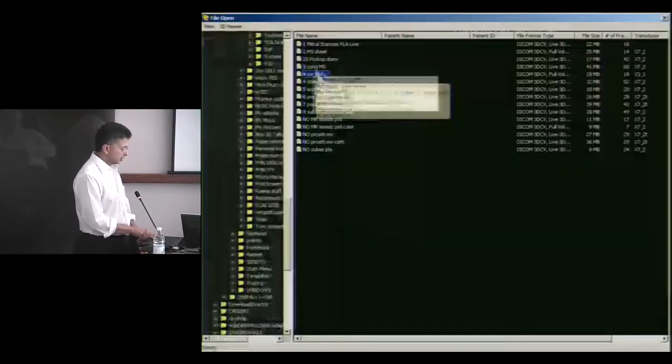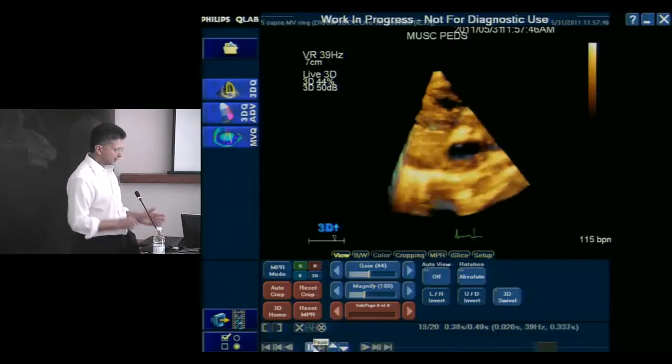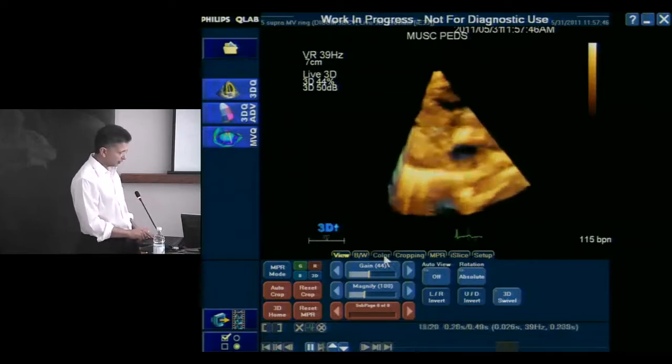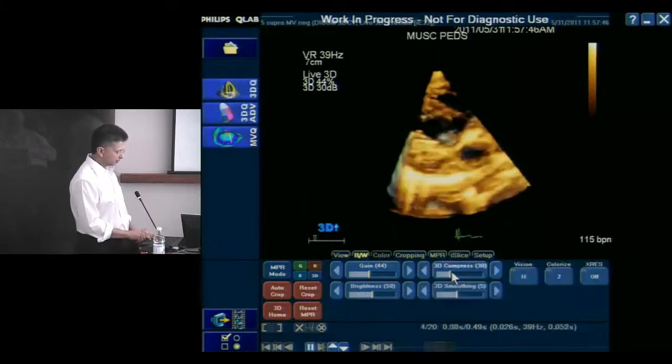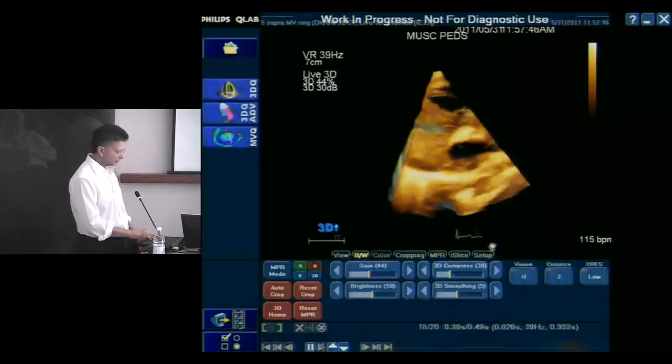All right. The next thing I'm going to show you is a supravalve ring. This was a kind of a complicated ring, and this was an interesting patient. It was a baby with coarctation of the aorta and this ring. Of course, inevitably also with subaortic stenosis and so on. And this was a big question because we had impressive gradients across this. Oh, there was a VSD as well. Impressive gradients across this ring. And the question from the surgeon was, do I resect that or do I just go after the VSD?